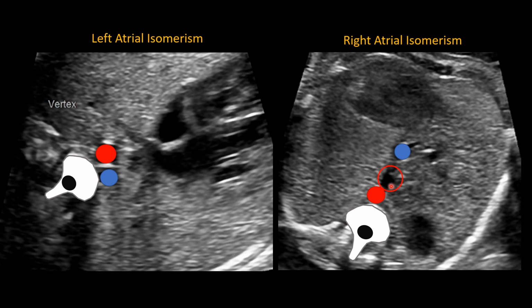This is actually an inferior vertical vein that courses below the diaphragm because it carries blood from a total anomalous pulmonary venous drainage confluence behind the atria. And so this would go inferior to the diaphragm and connect to the portal system typically, or the hepatic venous system, to carry blood anomalously back to the heart, typically in this case obstructed, and these fetuses will usually be in really bad shape postnatally.